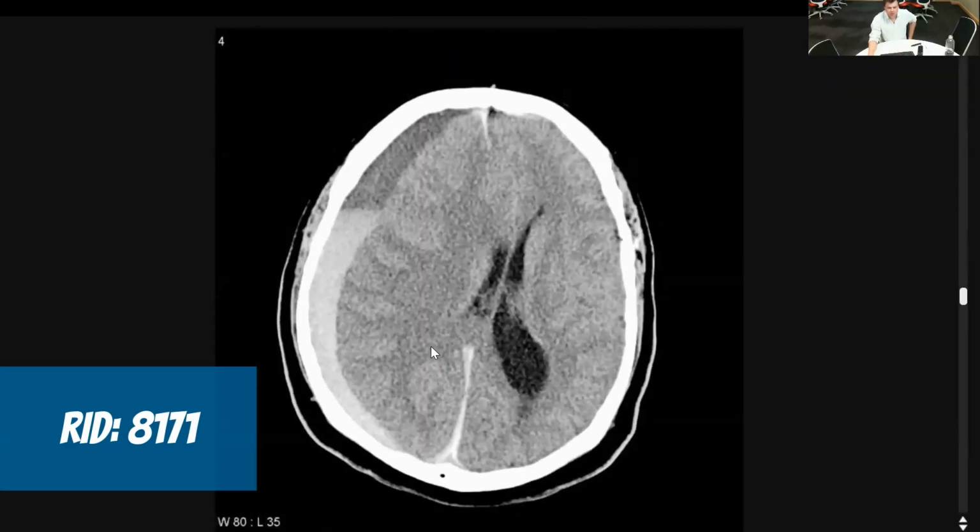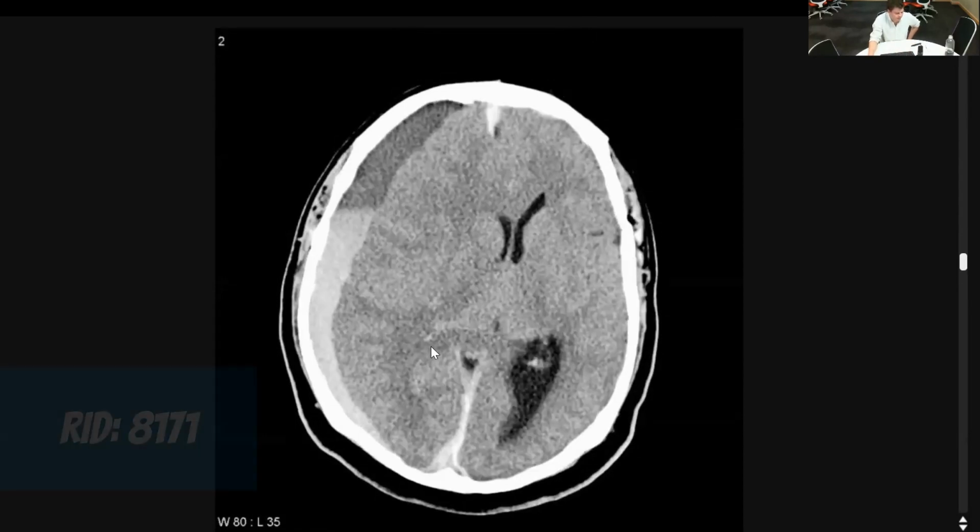And we've got this subdural here. Why does it look different, guys? Anyone want to say? There's old and new blood. Yeah, so we've got an acute on chronic bleed here. So this is the bit that Albie was starting to talk about with aging of blood. When it's acute, it's hyperdense. Then as it starts to age, you get protein breakdown within the blood. The blood constituents will start to settle and separate out. This is the old blood and clot which is broken down. This is the new blood, and you get this hematocrit level. You'll see this anywhere in the body. Remember, straight lines are bad. So this is an appearance of an acute on chronic with quite a bit of mass effect for this patient.